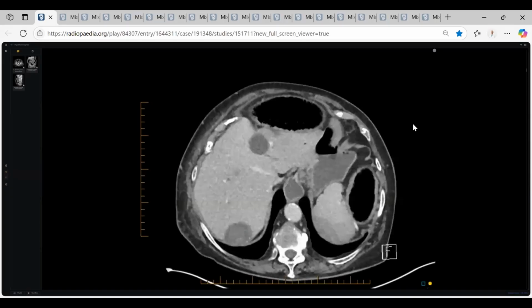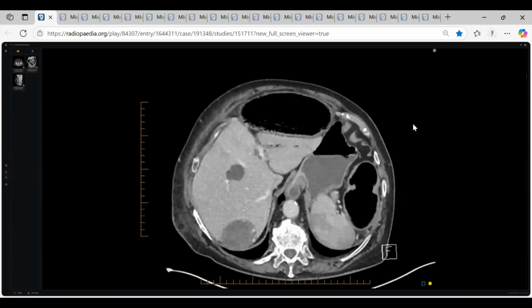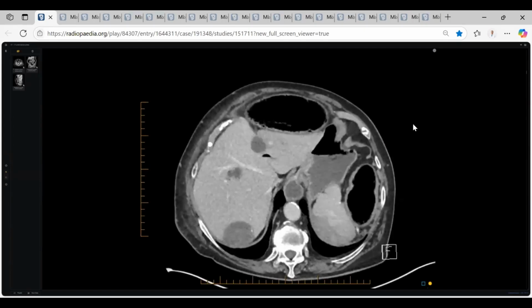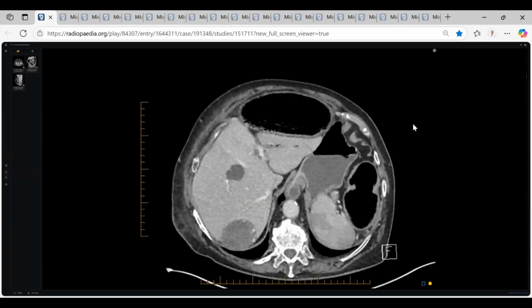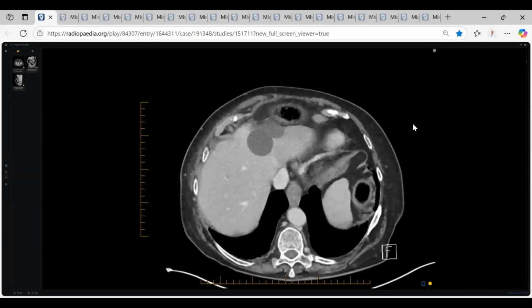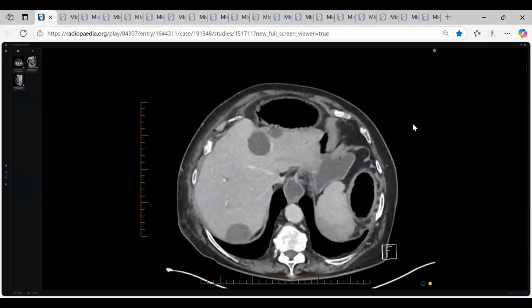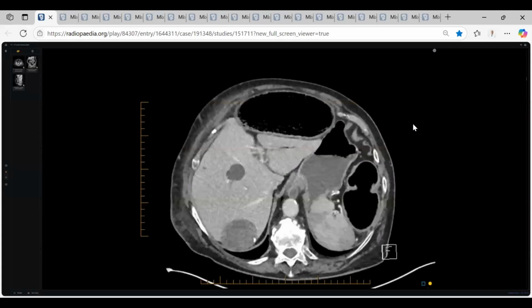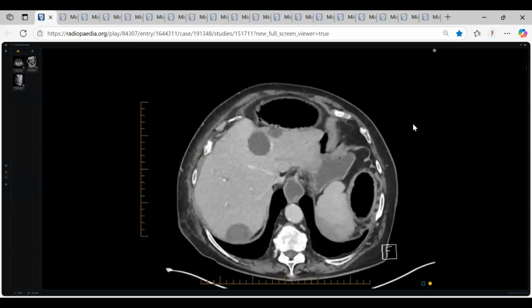Go up. What happened here in the liver? These appear to be cystic metastasis. Okay, don't worry about these cystic lesions. What happened in the left lobe? There are air foci suggestive of pneumobilia. Okay, so conclude. Give me a possible diagnosis. What is the name of this pathology? Pneumobilia, dilated bowel, and stone. Gallstone ileus.